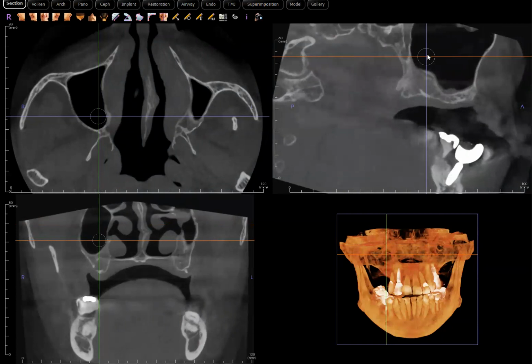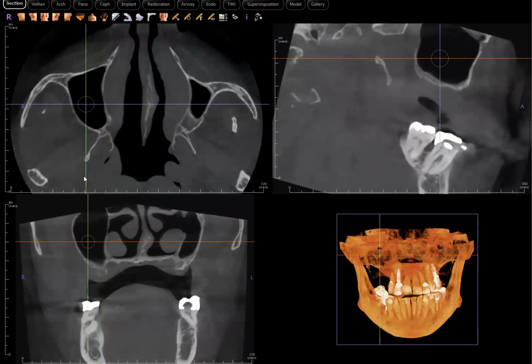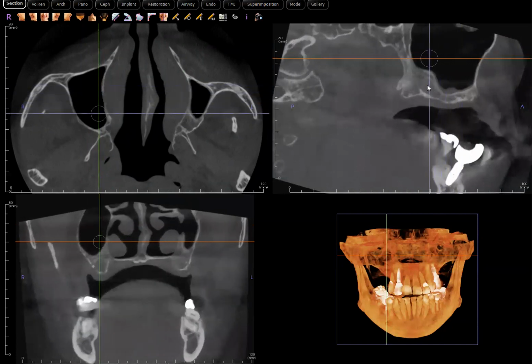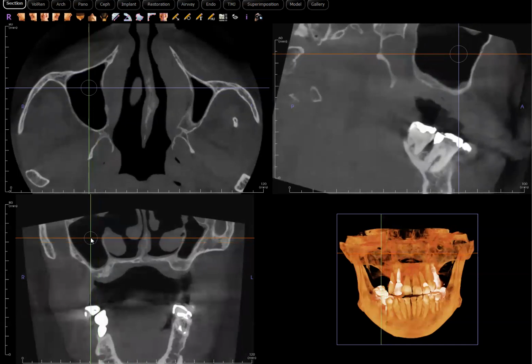And I just wish I knew what therapy was rendered. If it just spontaneously disappeared, which can also happen, that's great news for the patient. So besides this small localized mucosal thickening along the floor of the sinus, the right maxillary sinus is grossly clear. So that's wonderful for the patient, right?